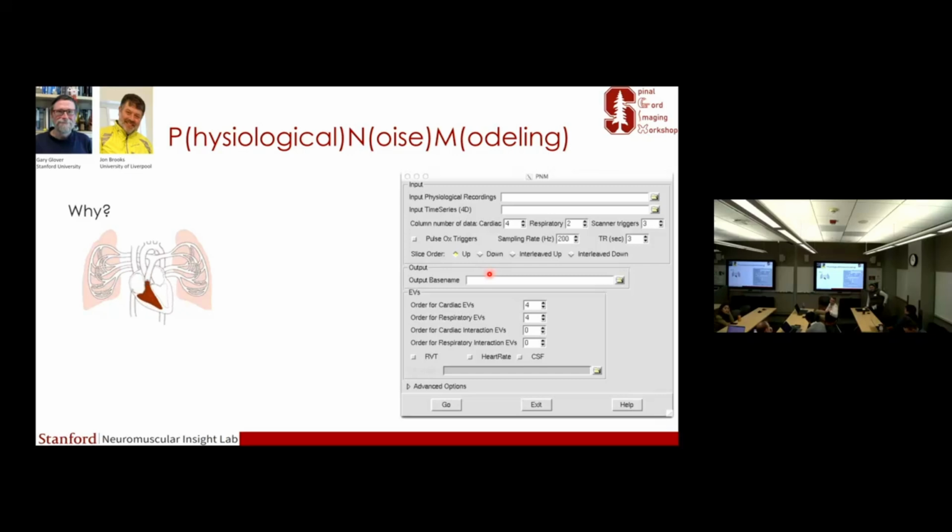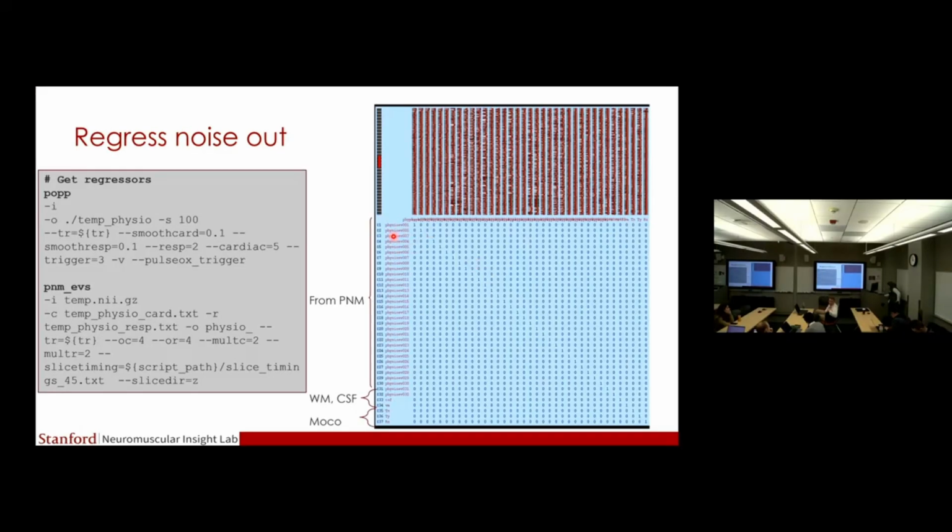So all the movement parameters for each slice. There are as many slices as you have, so many components. Exactly. So 18 multiplied by the number of slices, or whatever number of noise structures that you have. Yeah, and then they're all converted into NIfTI files. So slice-wise NIfTI files that are then used as regressors, and FSL handles those pretty well.